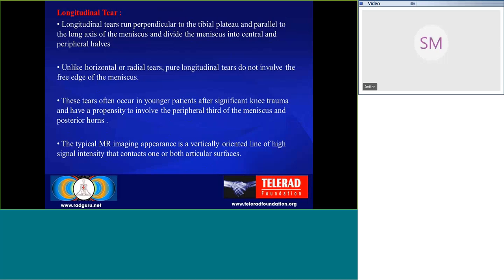On MR, we typically see a vertically oriented line of high signal intensity that contacts one or more articular surfaces. This is a pictogram model view of a longitudinal tear.